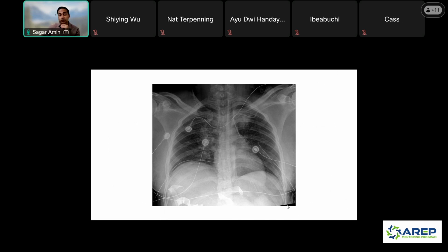And so the issue here is this central line is not in the right spot, right? If we're putting a central line in, we want venous access, and so it should end up on the right side down the SVC near the cavo-atrial junction near the heart. But instead of coming across midline, it's coming down overlying the aorta. So there's a few things that the tip of the central line could be in. So some things to think of are, anybody have any thoughts as to where this line could be?